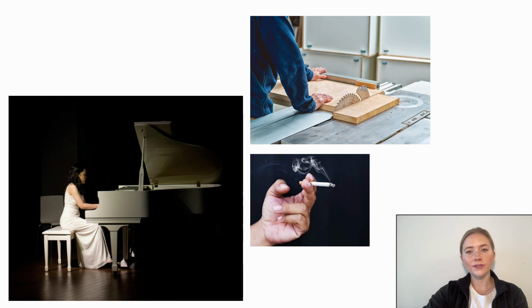Whether or not there is a soft tissue injury, it is always important to correlate hand X-rays to history and clinical exam. Knowing about the mechanism of injury and past hand injuries is crucial for properly evaluating hand trauma. For example, saw-related injuries tend to often be much worse than they may appear on initial exam, compared to a similar injury with a sharp knife.